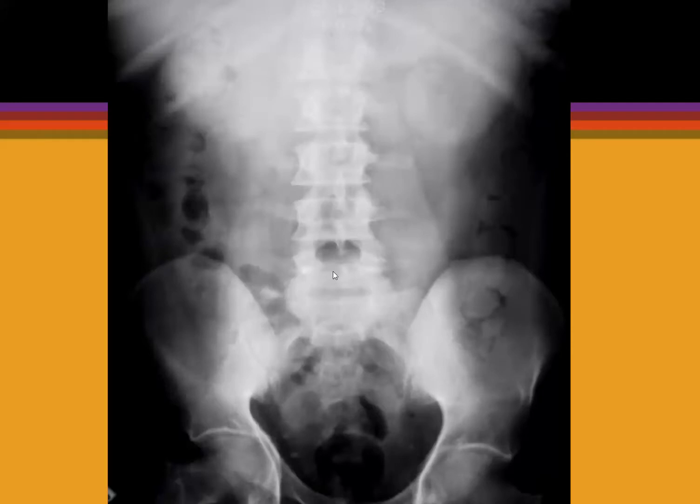And you can try and figure out how and what that is with the CT. You can see the sacroiliac joints. Sometimes inflammation can mimic abdominal pain.